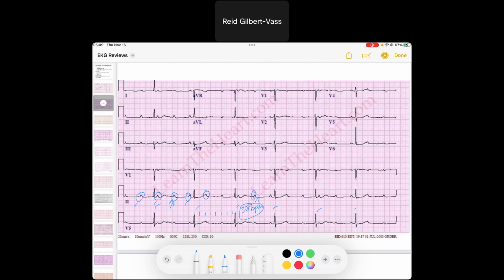The reason I know that is a P wave buried in that T wave is I compare it to the previous T waves, other T waves in that same lead, and you don't see that little notch. So I've got P waves that are marching through, so the atria are beating, and we know they are sinus P waves because they're up in I and up in aVF. The atrial depolarization is what it should be, but it's not communicating to the ventricles.